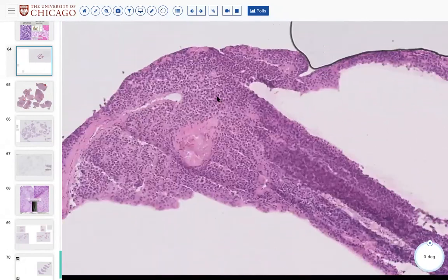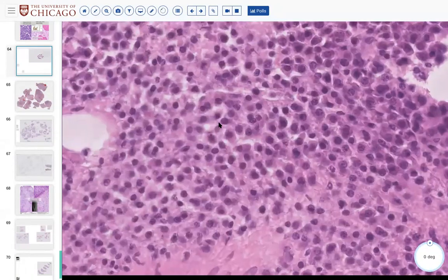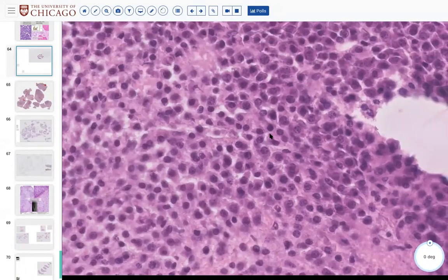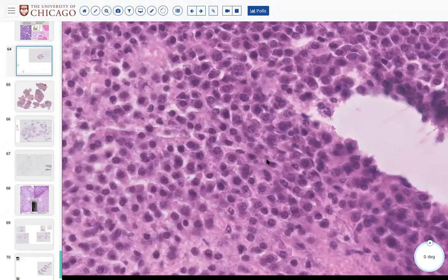The only thing I'll tell you on this is that it's also an adult patient with an osseous lesion. Reham says plasma cells. Yeah. So round nuclei with the chromatin, put whatever name you want to this chromatin, clock face, whatever, but basically areas of dark and areas of light.